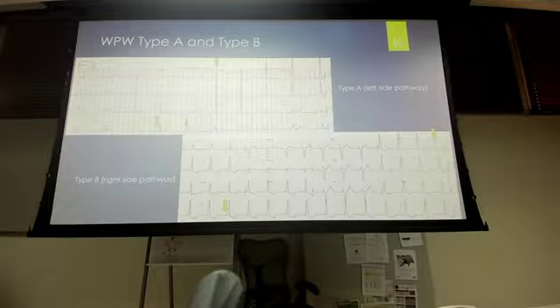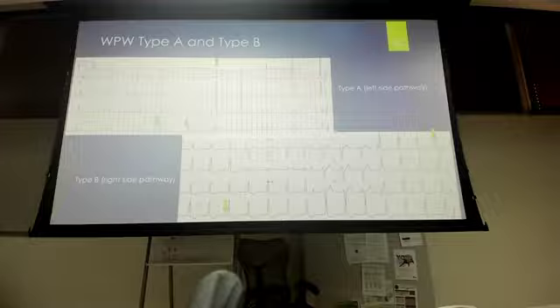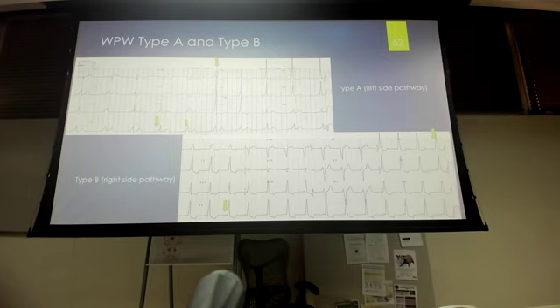We've talked about the T wave, and we have said that the T wave often follows the QRS complex, whether that QRS complex is more positive versus more negative. If the QRS complex is more positive, meaning your R wave is above your baseline, higher than your S wave goes below baseline, then our T wave is typically upright. If your S wave is deeper than your R wave is positive, then it's okay for your T wave to be inverted. It goes with the QRS complex.